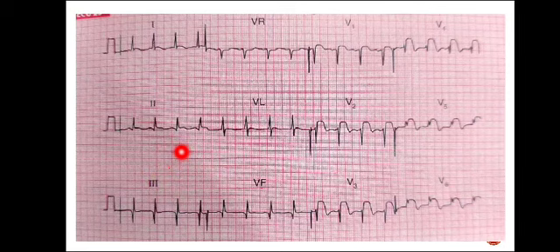And if I say that the patient has got streptokinase in his previous admission because of this old MI, will you give streptokinase again to this patient? And another question is that does this patient fulfill the criteria of thrombolysis? Yes, there are ST segment elevation in the chest lead which is more than 2 mm. So this patient meets the criteria of thrombolysis. What is the criteria of thrombolysis? That there is elevation of ST segment of more than 2 mm in chest leads, more than 1 mm in limb leads, and if there is new onset left bundle branch block.